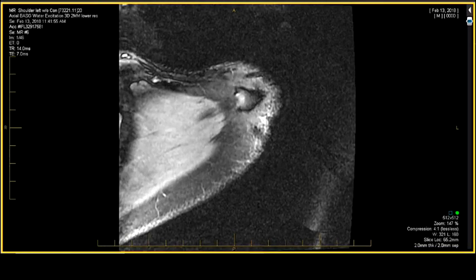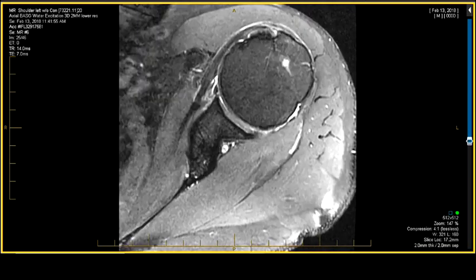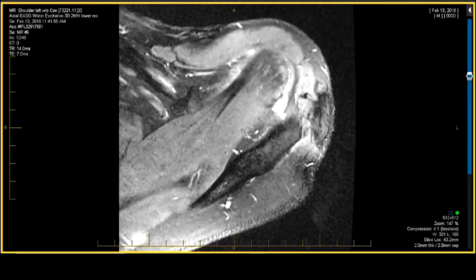70-year-old man with pain for 1 month after a skiing injury. Let's start out with the axial first, which I usually do, by the way. So the axial, I start up high. One of the first things I do is I evaluate the distal footprint of the rotator cuff from anterior to posterior. The footprint is very complex.